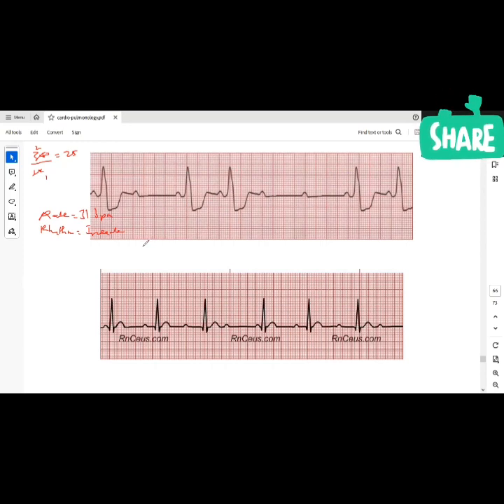There are two P waves. Now we're talking. There are some P waves here that don't have QRS complexes. Does that make sense? So this is my P, QRS, T. P here, where's the QRS here? It's missing. Can you see that? Then I have P, QRS, T, P, QRS, T. And I have P, QRS missing, P, QRS missing, P, QRS.